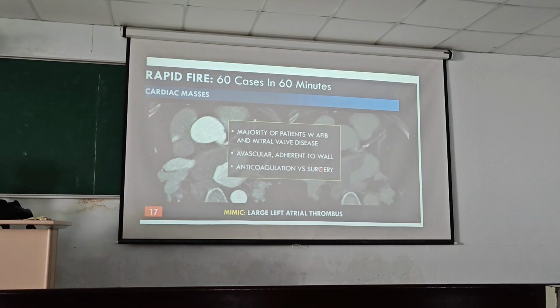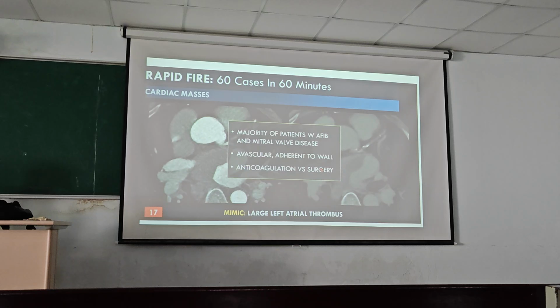Yeah. And then on the MRI, there are two contrast phases that you're looking for. One is first pass. So you scan and then you see the contrast go in and out. And if it's a tumor, then you can see it enhancing. And then you do a 10 minute delay, and that's when you do late gadolinium enhancement. The tumors a lot of times enhance, the clots do not.